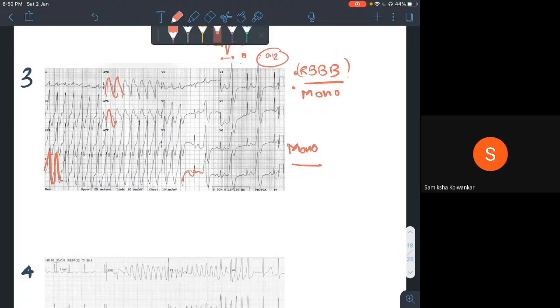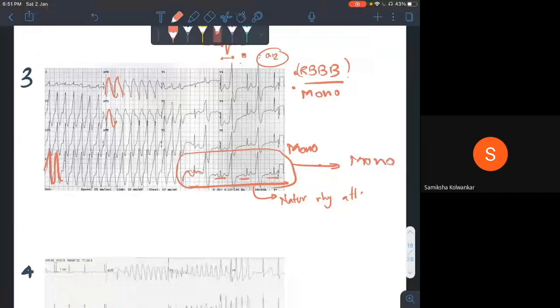It's all the same. It's all R waves. It's repetitive. There's no change in amplitude. This section of the heart, if you're wondering, is just the heart's attempt to go back into natural rhythm. But as you can see, it's not being very successful at it. So it's quite likely that going ahead, it went back into monomorphic VTAC after this till treatment was given.